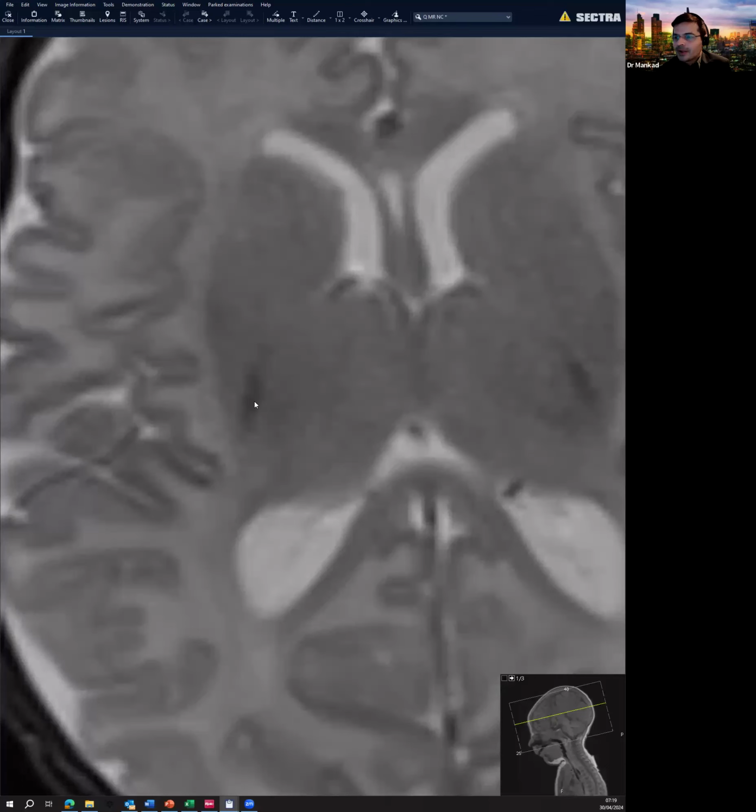And so, given the shift in contrast, we tend not to do a FLAIR sequence for up to 1 year of life. You won't easily see a FLAIR sequence in many, many cases. And that is because it is going to be very bright. FLAIR is very, very sensitive to the presence of water and fluid in the brain. But it has its role, particularly in the context of infections and trauma, etc., that we still do a FLAIR, but it's more difficult to interpret.